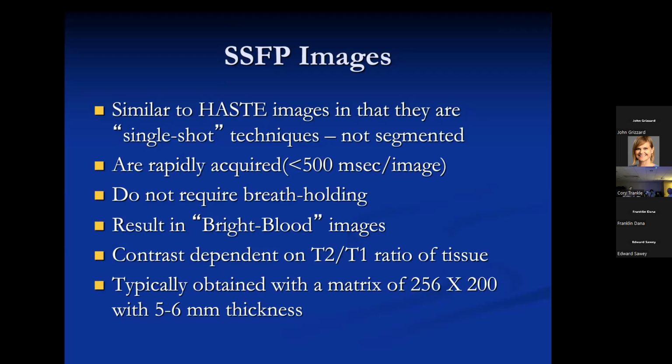Let me just mention we get these as we did the haste images with a matrix of 256 by 200, and typical slice thickness is 5 to 6 millimeters. We often do these with a small gap in between them.